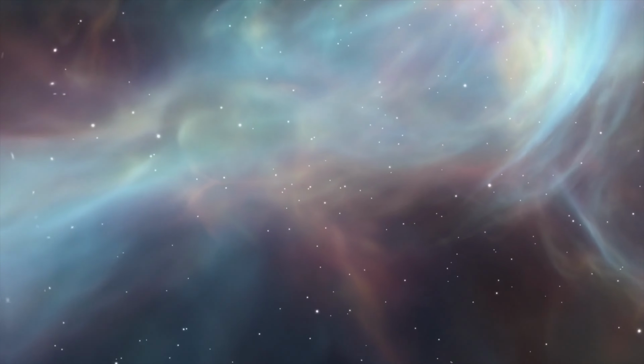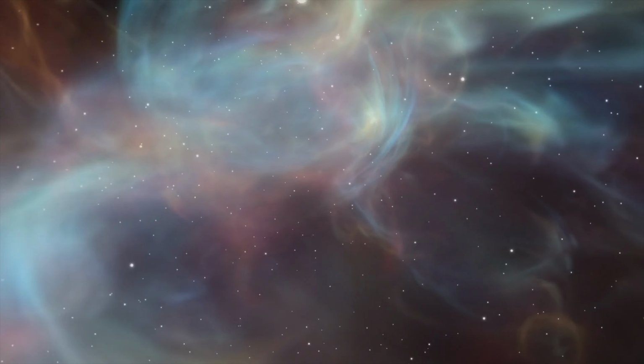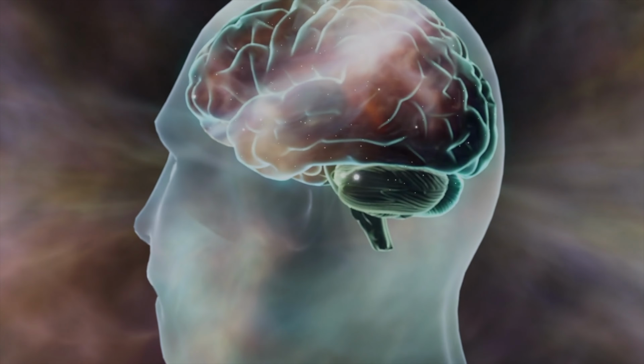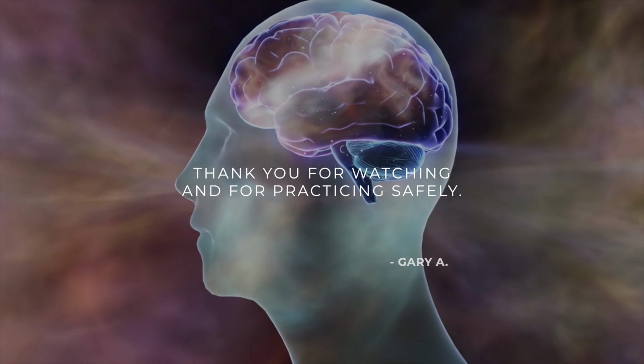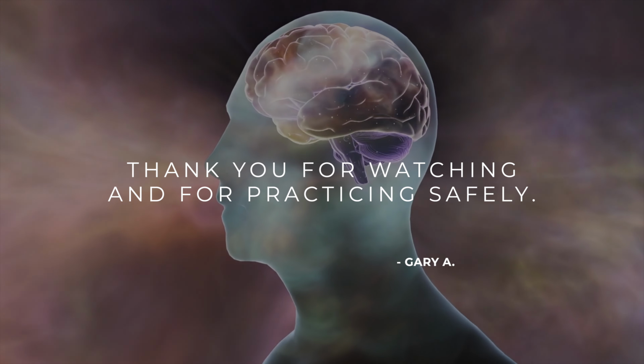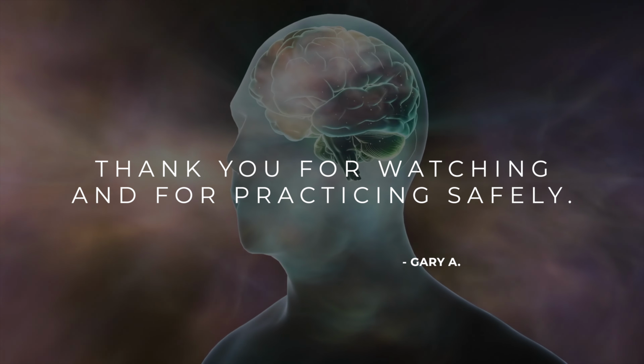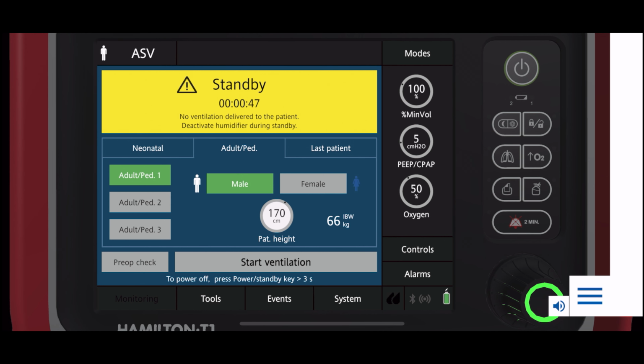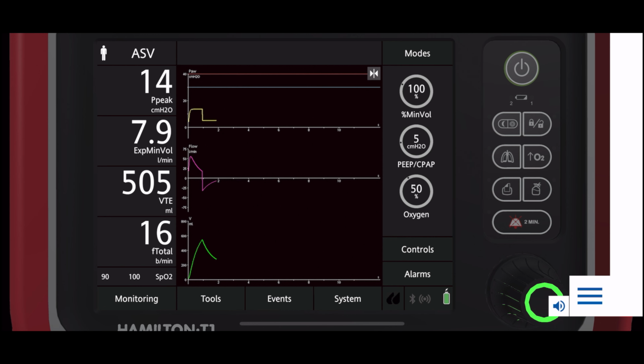In upcoming modules, I will show you how adjustments to the ventilator control settings discussed in this lesson are made for specific conditions. If you want to learn more about the Hamilton T1 or play with the ventilator controls, waveforms, and modes, consider downloading the free Hamilton VenTrainer application for mobile devices and personal computers.